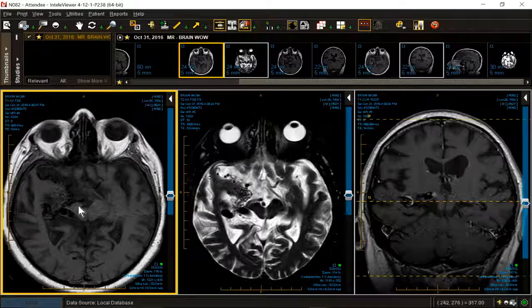There is atrophy of the midbrain, so both primarily and more seriously secondarily, there's Wallerian degeneration of the right midbrain. So this is considered one that would involve the brainstem and involve eloquent brain. This is how you assess an AVM every single time.